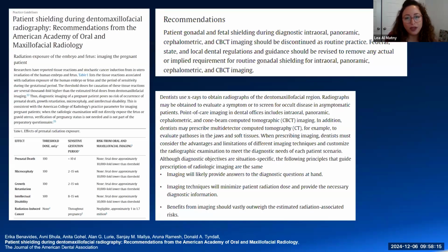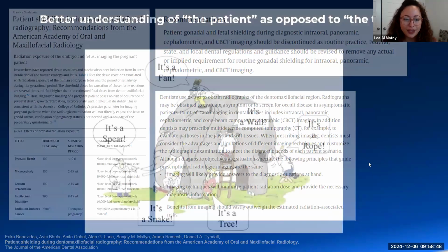And specifically with cone beam, because when it gets to the point where you are taking a CBCT scan, you either have a patient in pain and you want to find out where the pain is coming from, or you need guidance in deciding on treatment plan or the prognosis of a tooth. So either one of these two, you're not just regularly taking bitewings where the patient comes in for a checkup. At this point, there is a purpose for that CBCT scan.